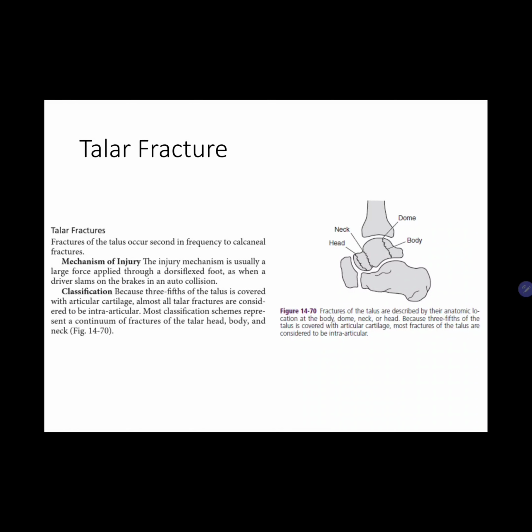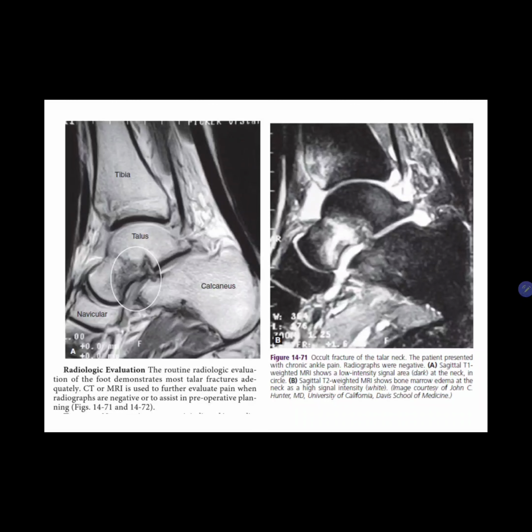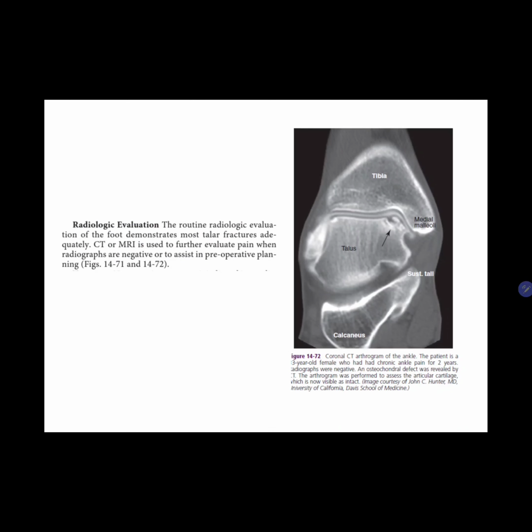Alright, so this is the radiologic evaluation, and then once again another radiologic evaluation, an arthrogram of the ankle, which shows an osteochondral defect revealed at the talar part. Alright, so for the treatment is this one. Complications. And then we go to the midfoot fractures.